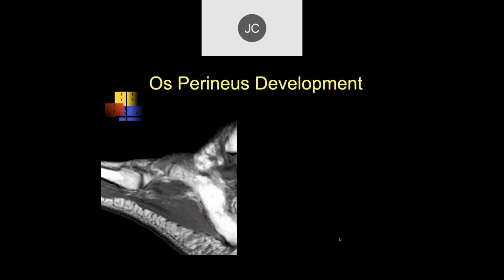Oleg, what do you think of this? This is actually the location of the distal peroneus longus tendon right in through here. So like diffuse thickening, like maybe a tear. Okay, good. It should be black.